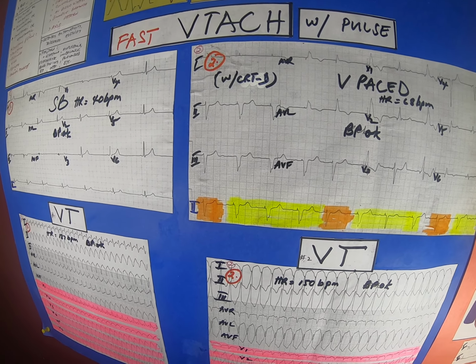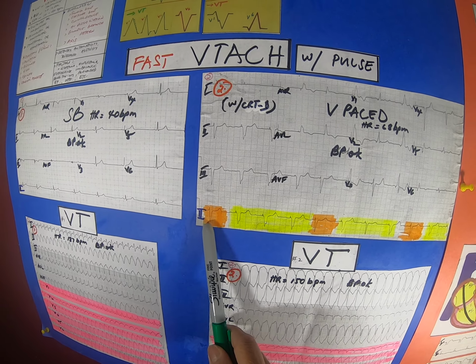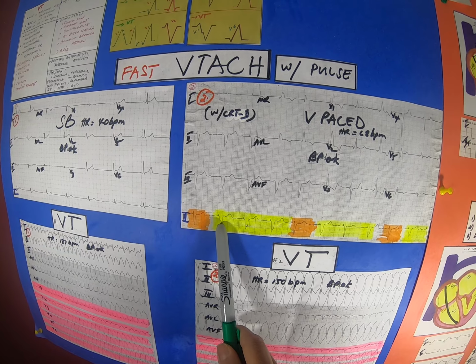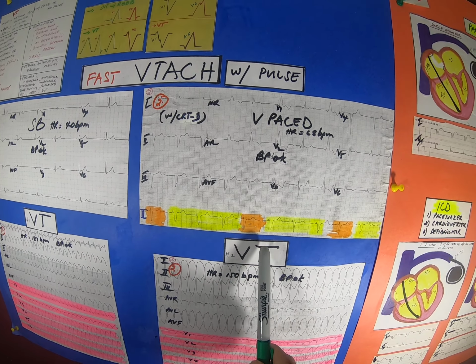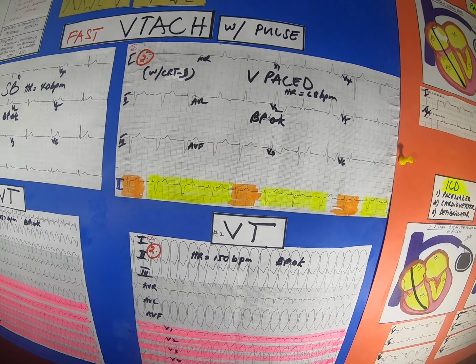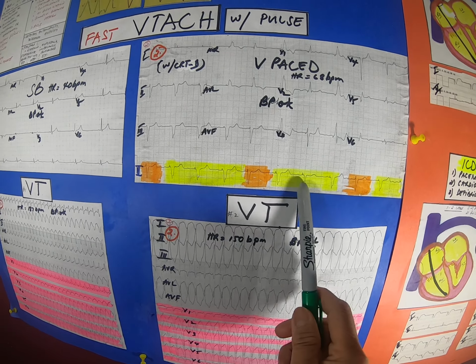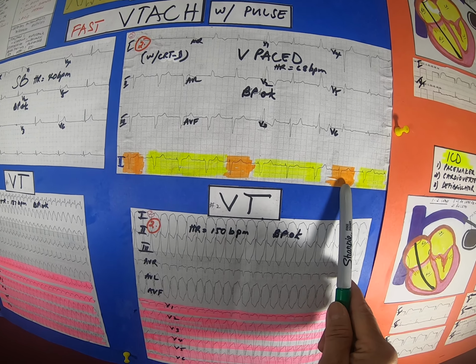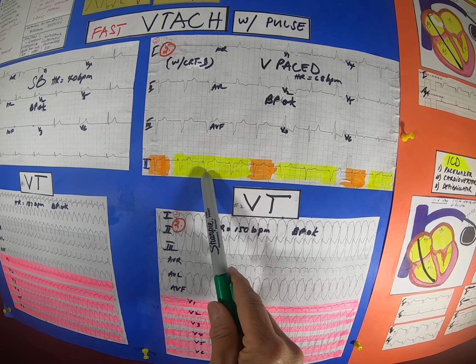So this is the ECG of the patient. If you look at lead 2, you have here an inherent QRS. We got V-pace, V-pace, V-pace, inherent QRS, V-pace, and we have here a fusion beat. That is 2 stimuli stimulating or depolarizing the ventricle, and V-pace, an inherent beat, and V-pace. Sometimes you see 2 spikes, sometimes you don't.